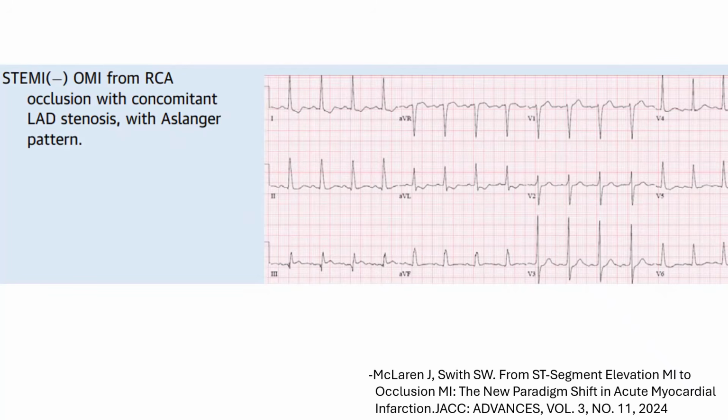So when the LAD gets ischemic, the CTO territory gets even more severely ischemic and develops subtle ST elevation along with the diffuse ST depression attributed to the left main and LAD ischemia. So it's a subtle ST elevation from diffuse subendocardial ischemia that is more pronounced in the territory of a CTO.